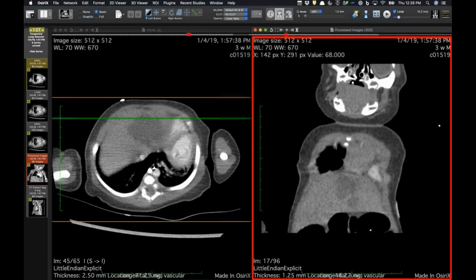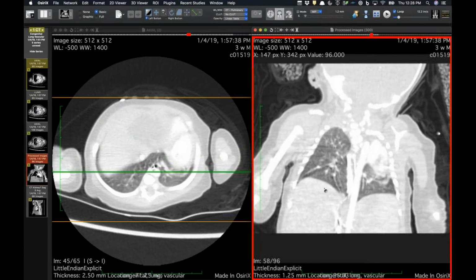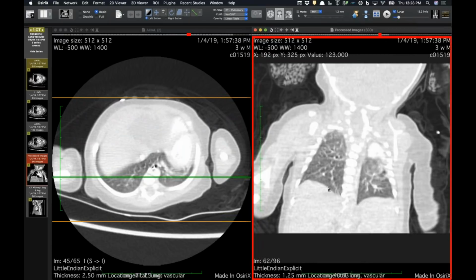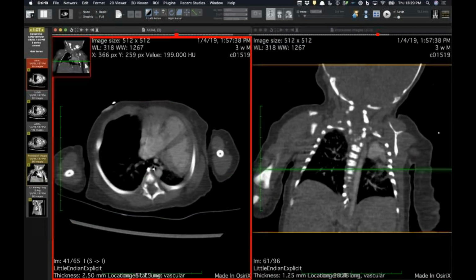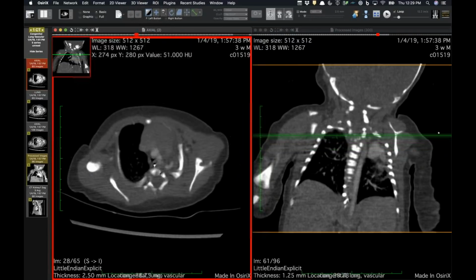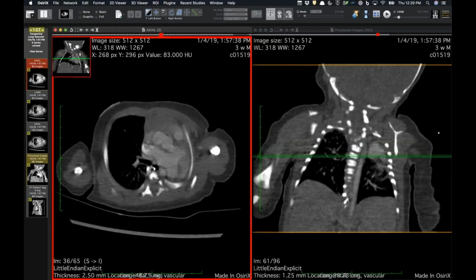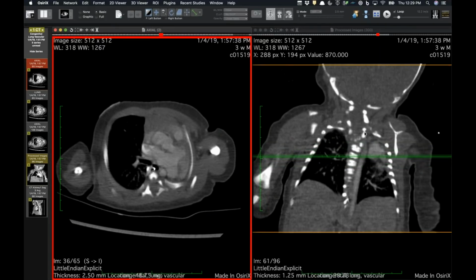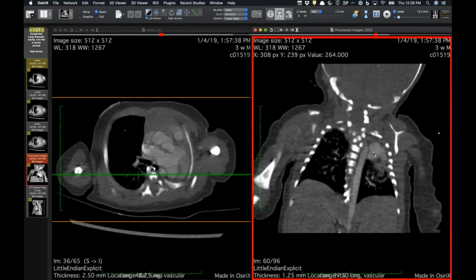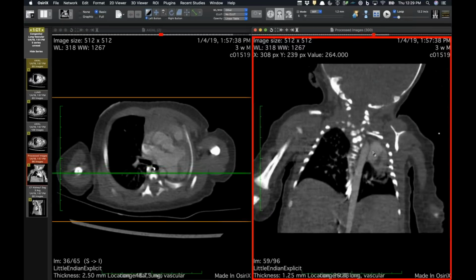Yeah, it's been called the hypoplasia agenesis complex too, where it's more like a spectrum of findings. But I thought this was interesting because he had come in billed as hypoplasia of his left lung with just tracheal narrowing and abnormal branching pattern. But clearly this just looks like a right lung, and he's got multiple other abnormalities. He's got vertebral abnormalities. He is being worked up for syndromes now.